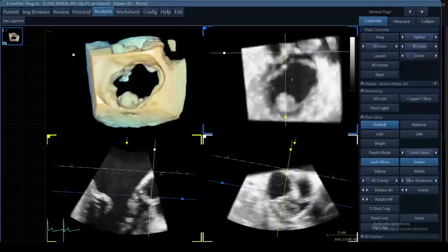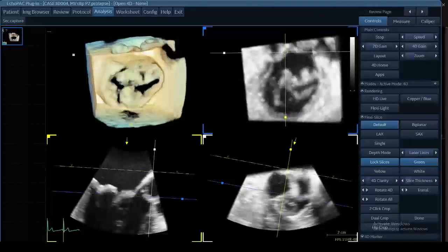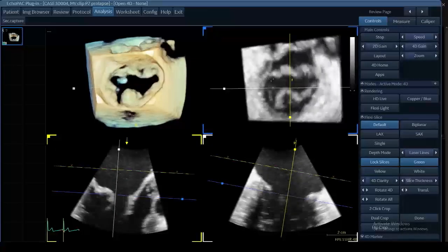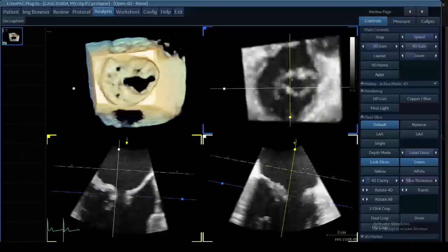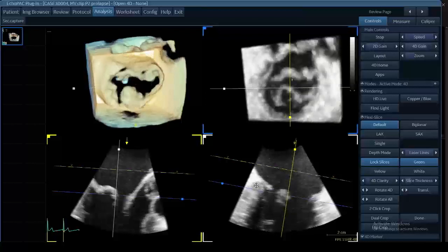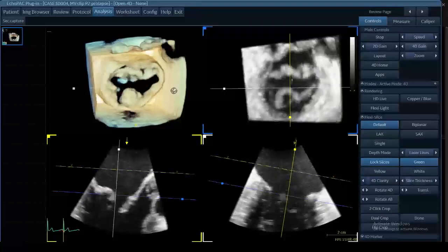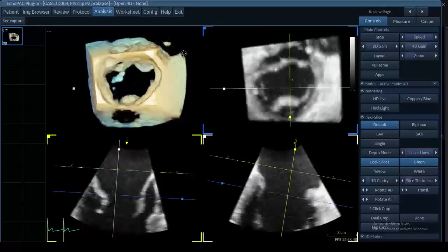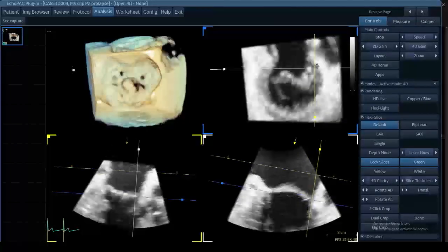and now I see where the aortic valve is, I have it in short axis here. If I'm uncertain which one is medial or lateral, I need one reference. So typically when we're doing cases, and sometimes it becomes confusing, you're uncertain which one is medial, which one is lateral on the white plane. I'm a bit uncertain, but what I'm certain of is the landmarks on the 3D image. We said that the tricuspid valve is here. So all I need to do is move medially on this short axis.